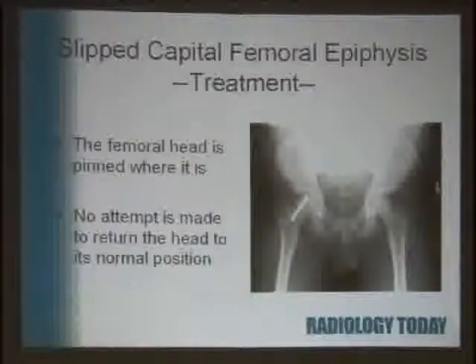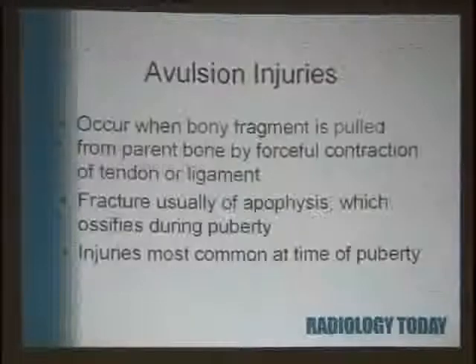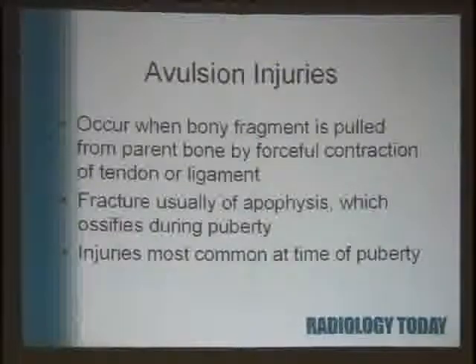And what they do is they pin it right where it is. If they try to drag it back up, evidently there's a risk of really tearing and destroying the blood supply, and then you'll give them avascular necrosis. So they just pin it where it is. And I find on the follow-up films, I have to make myself look at the other side, because they can have disease in the other side, either synchronously, at the same time, or later. You get so distracted by this big pin, you forget to check that side. So far, he's okay. Okay, now we're almost finished.